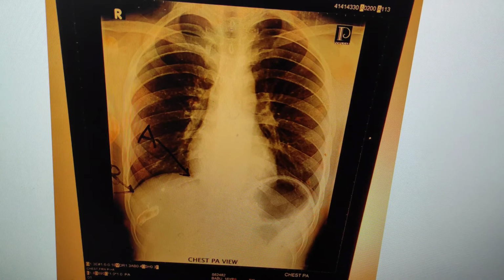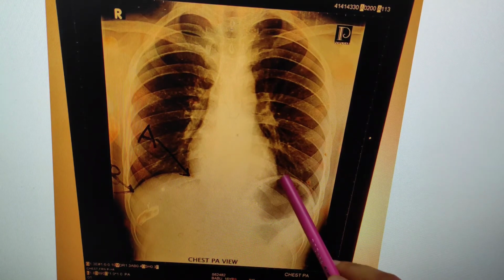Radio-opaque occurs when the X-rays get interrupted by viscera or bones, then it becomes white in color, and when it goes through air, like in the lungs or the fundus of the stomach, where there is fundic gas, it becomes black in color. So that's the radiolucent and radio-opaque shadow, and these angles are normal.